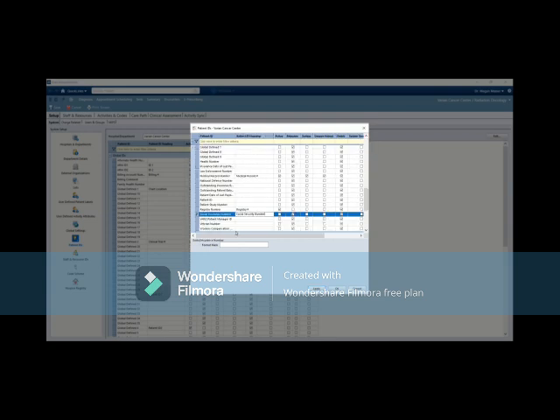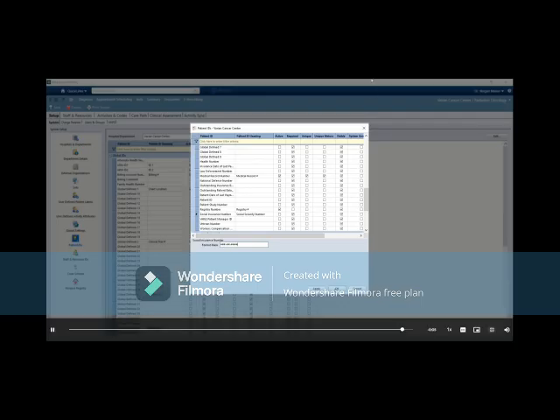To define a default format mask, select the patient ID from the list and type the format requirement in the Format Mask field. Use the hashtag symbol and dashes to represent the desired format. Click OK to save and close.